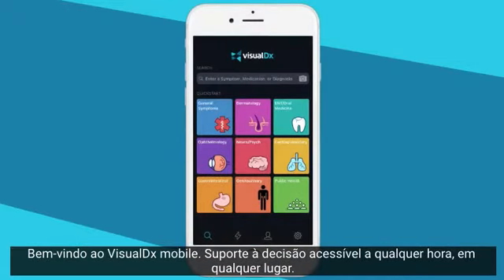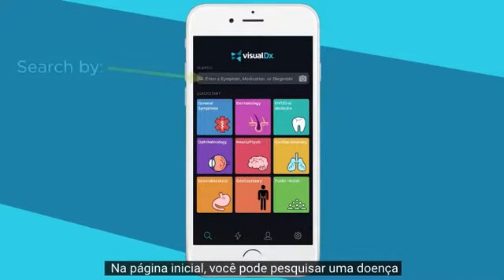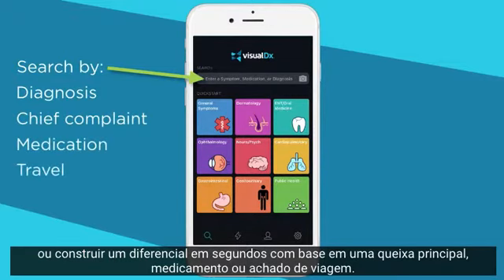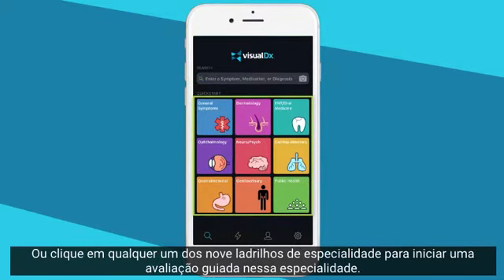Welcome to VisualDx Mobile, decision support accessible anytime, anywhere. You can access medicine's fastest second opinion at the point of care. From the homepage, you can search for a disease or build a differential in seconds based on a chief complaint, medication, or travel finding. Or click any of the 9 specialty tiles to start a guided workup in that specialty.